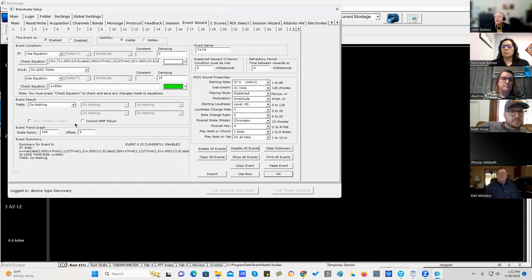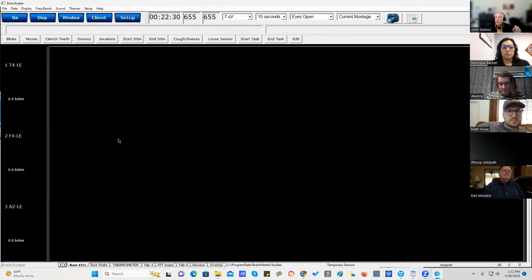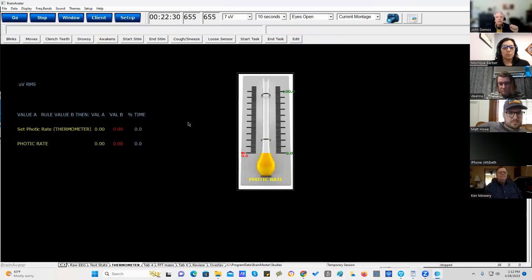It has to be eyes open. We cannot change the bands. You can in QEEG Pro. It must be eyes open, and the bands are fixed. The age is fixed by when you open up the report and you said the client is 44, then that's the age. Now, what else can you do with Jules Z-scores that you can't do with QEEG Pro is, of course, you can combine photic stim. All right, it's right there. Is it required? No. Is it an option? Yes. You would need to have an Echo with the Discovery in order to drive this, an Echo and photic stim glasses, and you would need Stim Flash software.